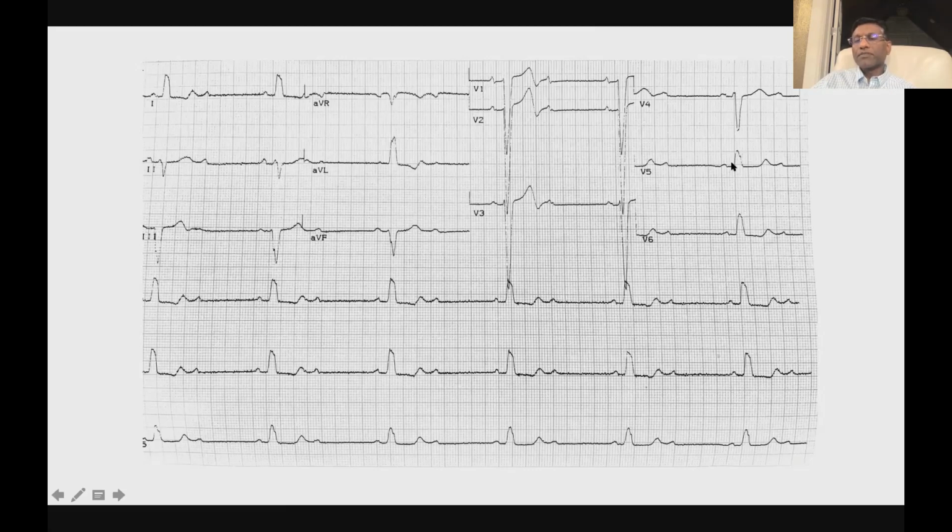And so in the left-sided leads, looking at the ventricle coming right at it, the LV being depolarized, you have the slurred activity coming towards it. And so you have slurring on the upstroke from the beginning to the peak of the QRS. That's called delayed. It's a fancy word just for saying slow activity across the left ventricle coming towards it here. Delayed intrinsicoid deflection.